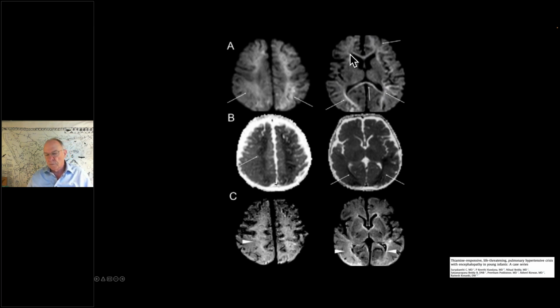These changes, which we have seen in 2 of our cases in this case series, are again, I think, in the neonatal or early infantile period group. So cortex and subcortical involvement is one pattern of thiamine-related deficiency disorders, but more specific handles are the periaqueductal region and mammillary body involvement. Yeah, these are the sort of acquired thiamine deficiency, not the thiamine biotin responsive syndromes. Yeah. Okay. Thank you. That's helpful.